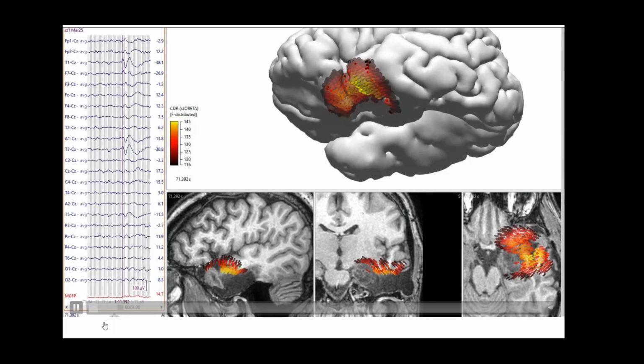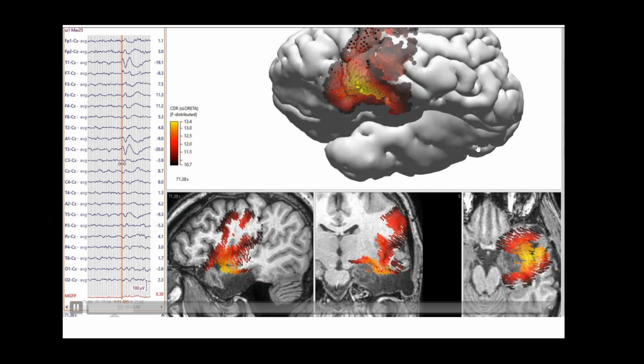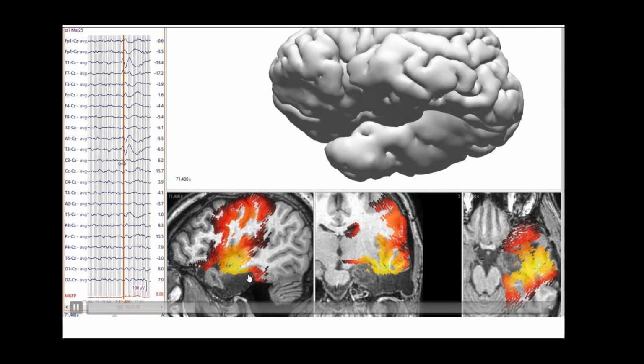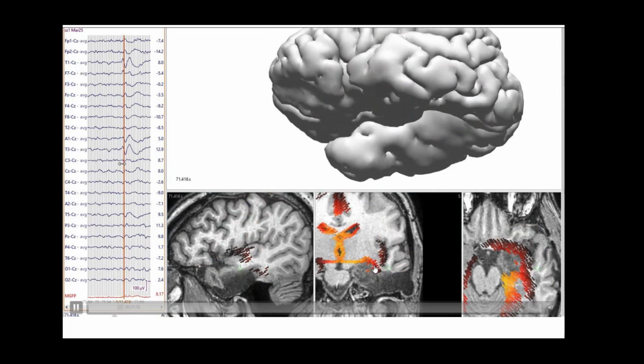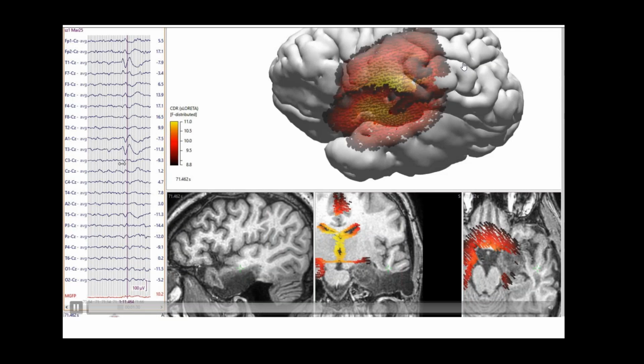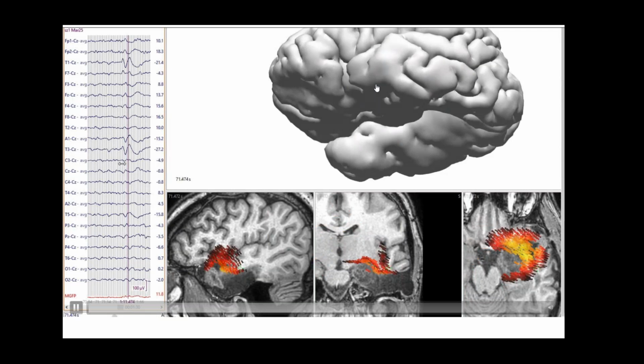Let me see how it works. Yeah. So now you see the firing of the spike start at the temporal cortex, and then you get involvement of areas in the orbitofrontal cortex, the lateral cortex, and all these areas that get recruited for this spike to have this activity.